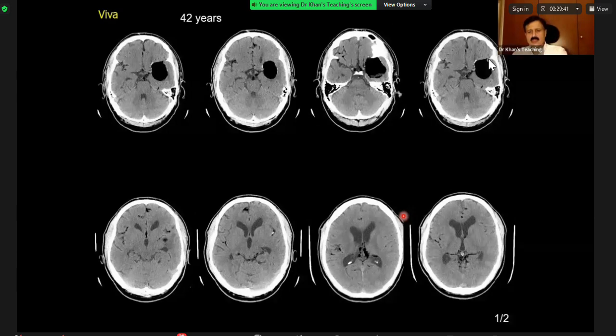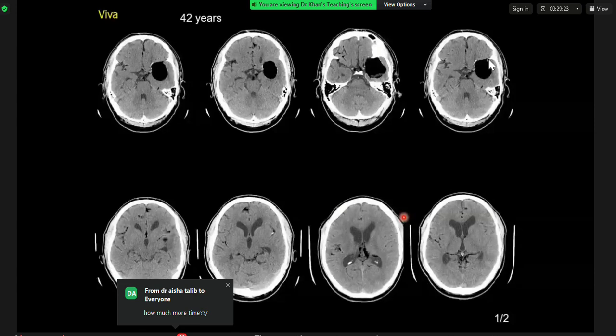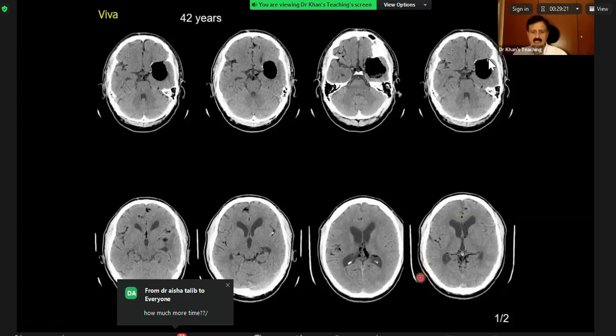What is the spot diagnosis here? I have shown you this case, but on an MR. So I think there's a significantly low attenuation lesion in the left temporal region. I think this is possibly fat. So I think it's a dermoid cyst, possibly. Which has done what? Ruptured.